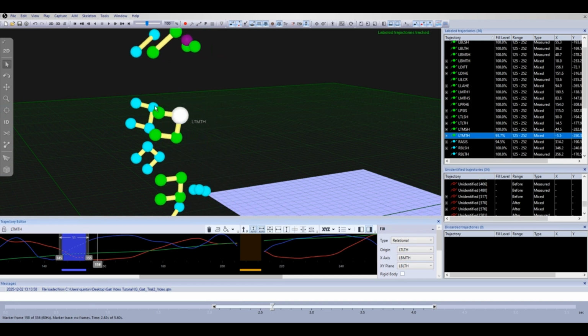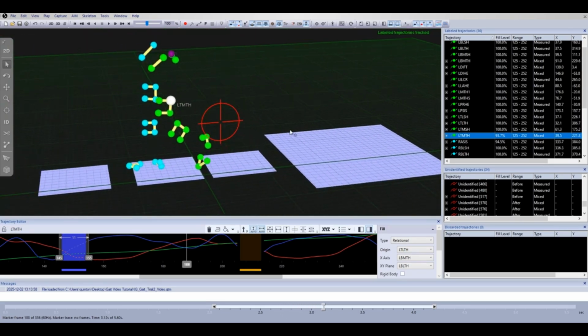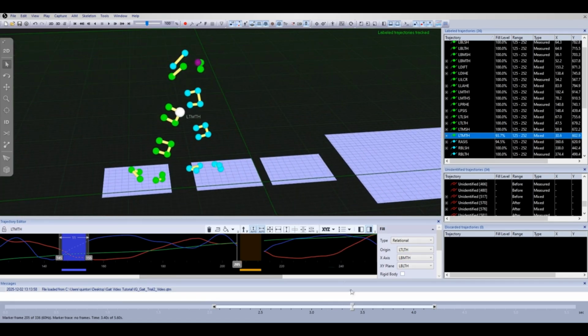And now we're going to do the second gap, as you can see. So feel free to pause, rewind if you need to, or skip forward. But I'm just going to show you guys again as another example.